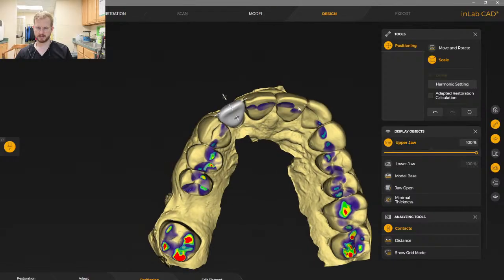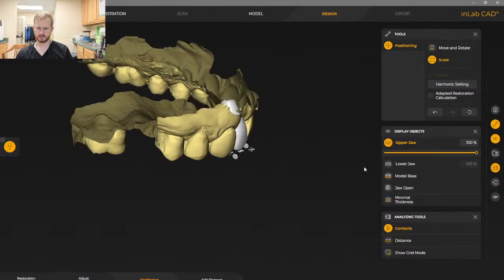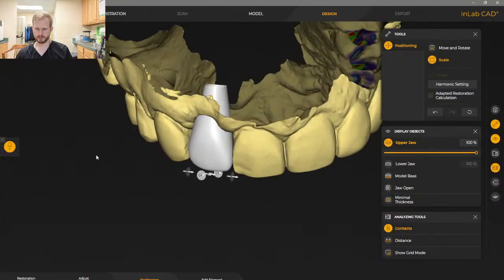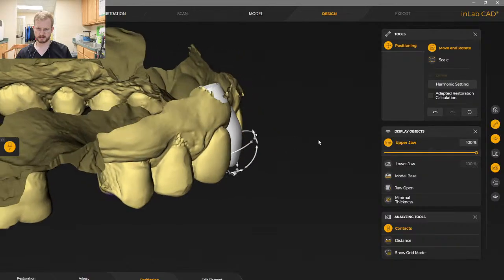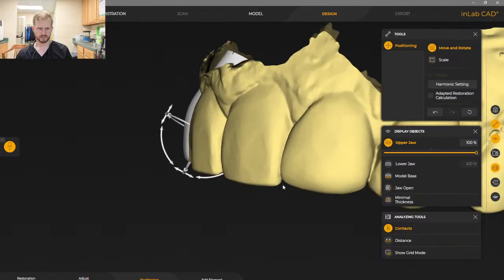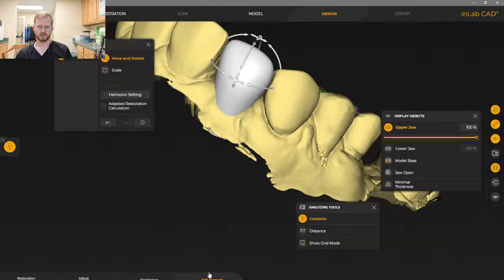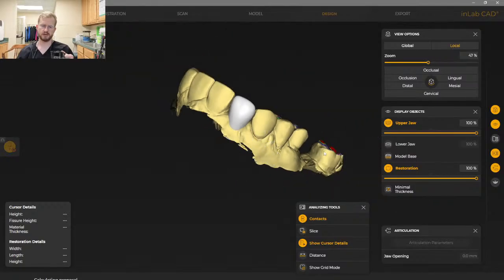This patient's got some veneers that look pretty bulky. This was done at another office. But we're going to try and match what he's got. Let's take that in just a little bit. Okay. Let's try that one. Let's go to edit element. It's going to give us a proposal. It should just attach our tooth to the margins and give us exactly what we just positioned.